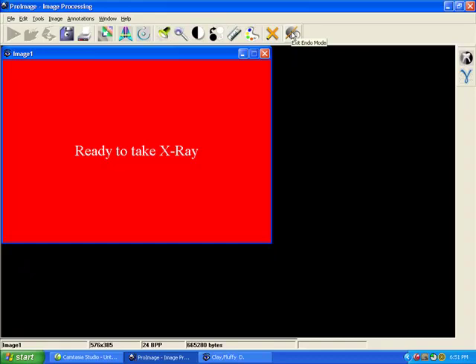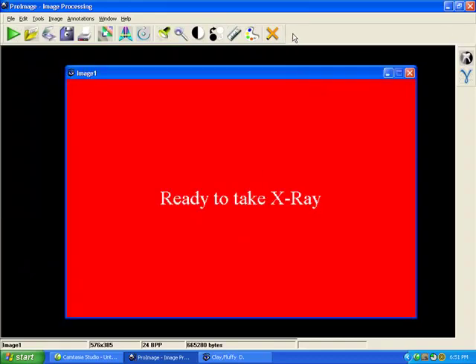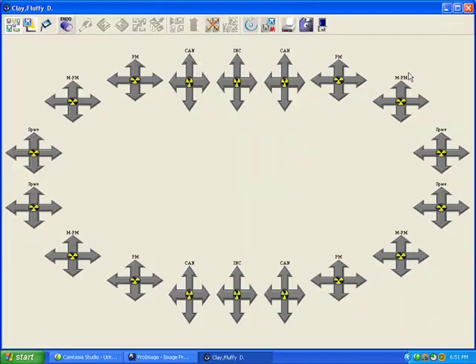When you hit the Exit Endo Mode button, when you click on it, basically it will display in that image processing screen every shot you took. You then hit the X in the upper right corner to close it out, and it returns you to this screen, and the one position that we chose will have all of those pictures stacked on it.